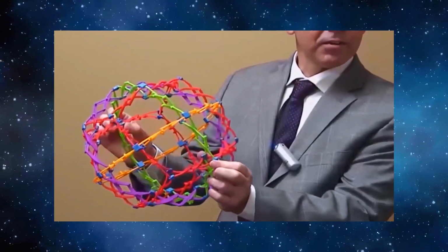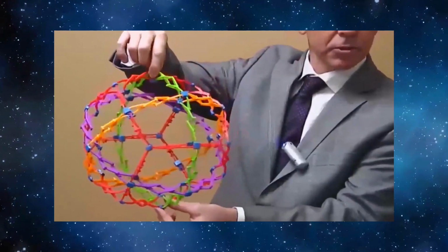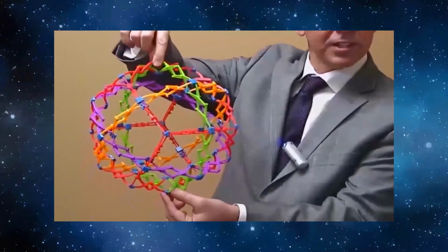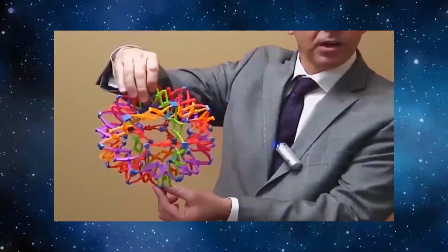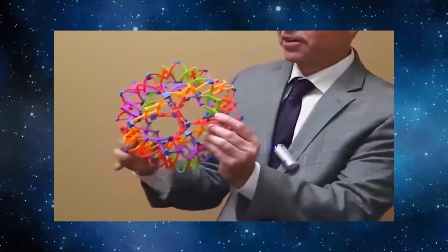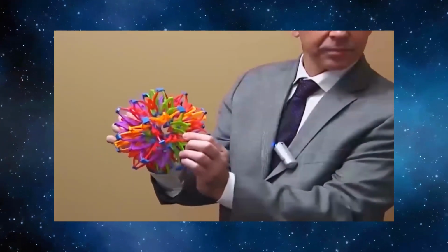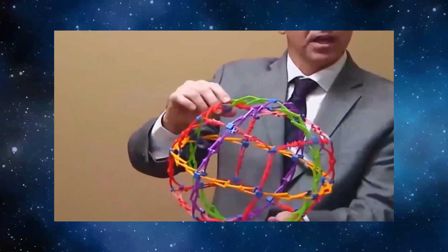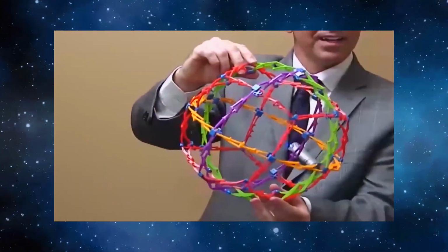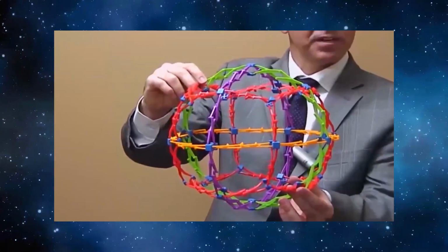I expand back out. Now, the interesting thing is that during the same motion, while the Hoberman sphere is contracting down, it's experiencing negative longitudinal strain, while at the same time experiencing positive radial strain. Now, the other direction that we want to look at is the circumferential direction. And this is represented by the yellowish-orange line right there in the middle of the sphere.